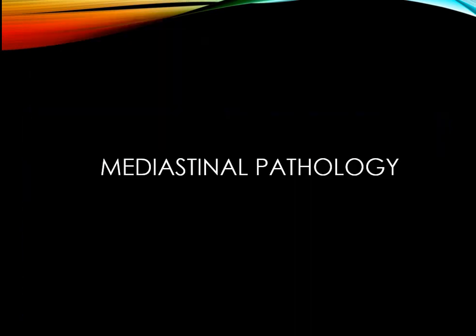Mediastinal pathology. موضوع الميديستاينال باثولوجي موضوع طويل راح نتناوله إن شاء الله بالمحاضرة النظرية، ولكن لا بأس أن نعطي بعض الهنتس وبعض الحالات عن الميديستاينال باثولوجي كإكزامبل.